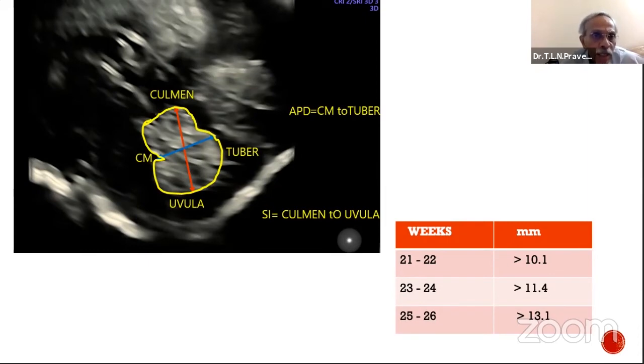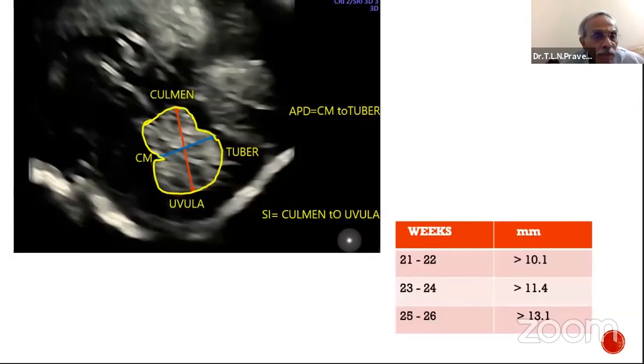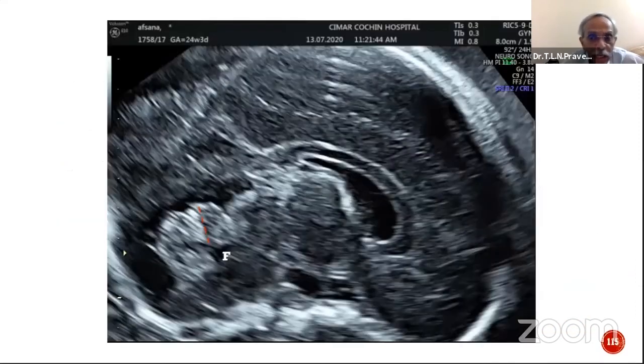Because once you have the area, you can have a ratio between the BPD, and then you can assess the smallness of the vermis. The second important factor is the morphology. Morphology, as we know, has been very clearly delineated. There are basically three lobes. The most important thing is this indentation, which you can see because of the primary fissure, which is extremely important.